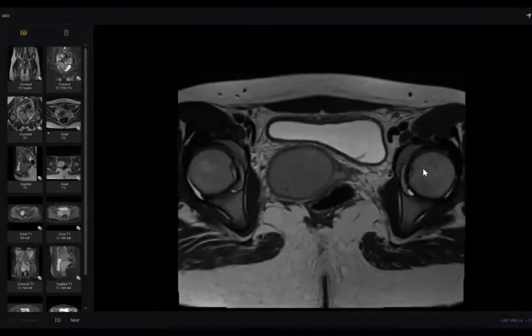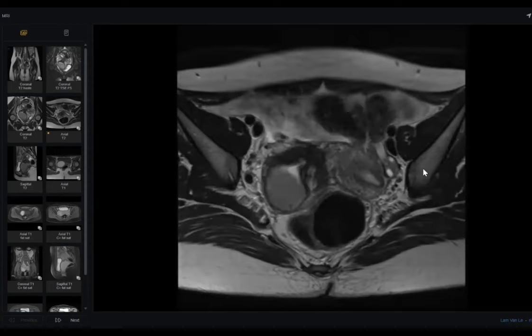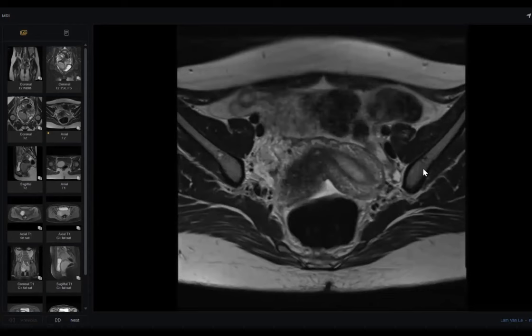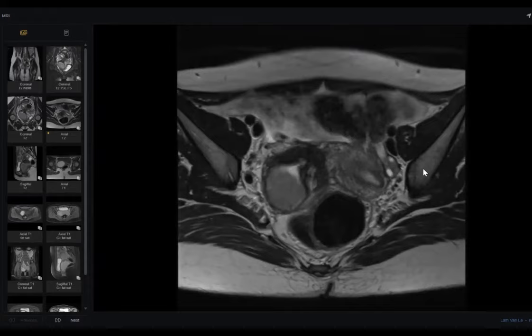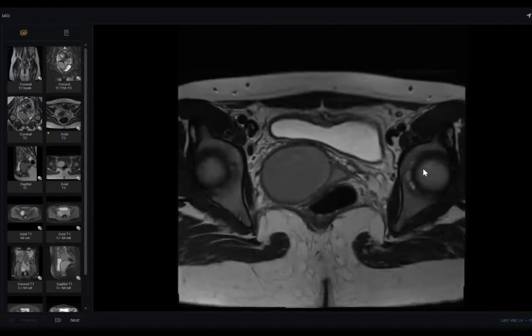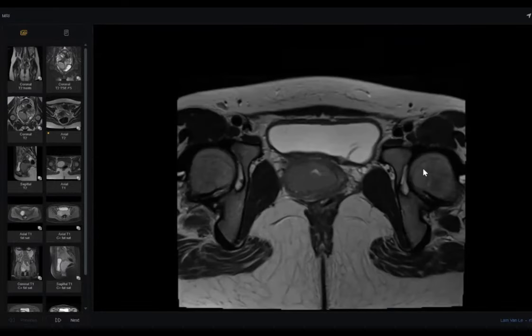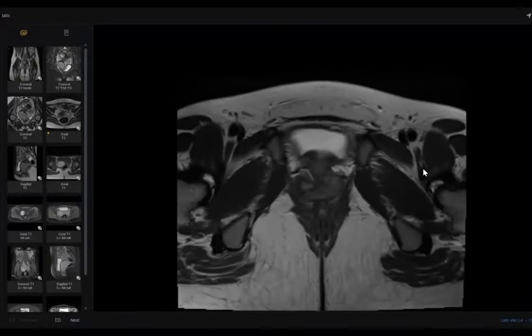What do you think about this lesion? I can see two uterine cornua, sir, and also a large lesion. I think probably it is a dilated cervix, which is containing some internal T2 heterogeneous contents within.